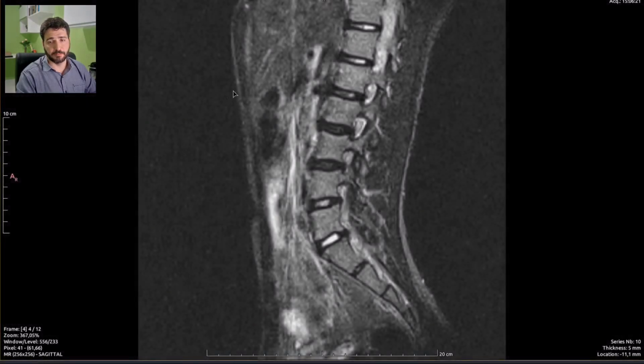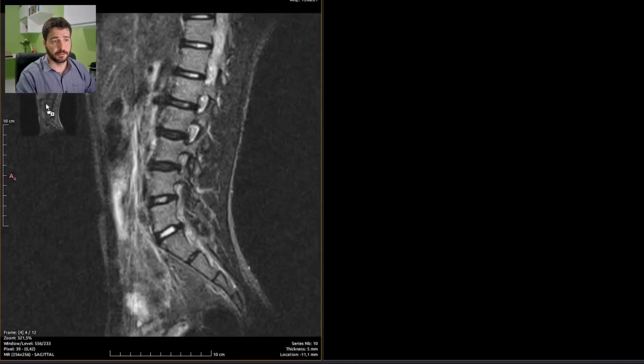I have already hit the download button. This is an even younger patient. This is a 14.5 years old male patient, who says, let's see, it's taking a little bit to load. Let's get the images. They have already been loaded.